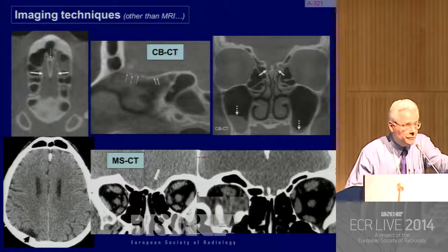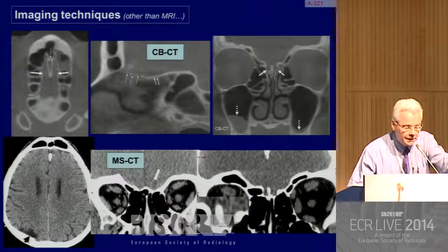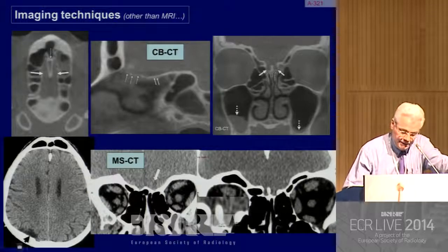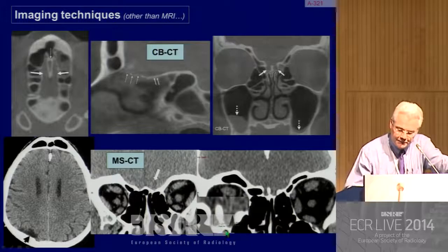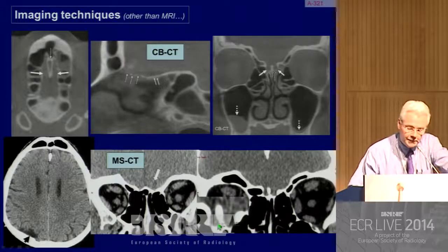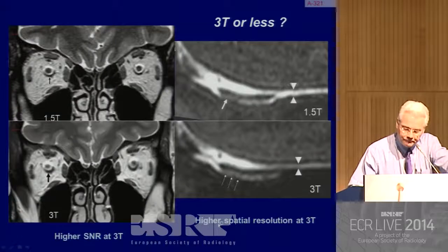He didn't want to undergo MRI because he was claustrophobic, and instead of performing MRI, we were constrained to perform a CT. And you see that there was contusion, there were sequelae of contusion, but also, it's a little bit limit, of course, there was also an atrophy of the left bulb. Of course, we should have preferred MRI to see it.